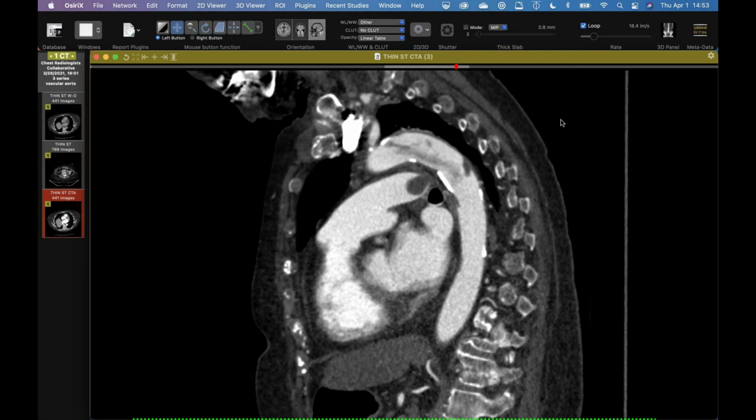Yeah, and those were even lousy 3 millimeter thick slices. The tip-off was the funny vessels. As you got up peripherally, they got really big again, like you see with systemic arterial supply elsewhere. Yeah. I'll show a fast case, Jeff. Sure.